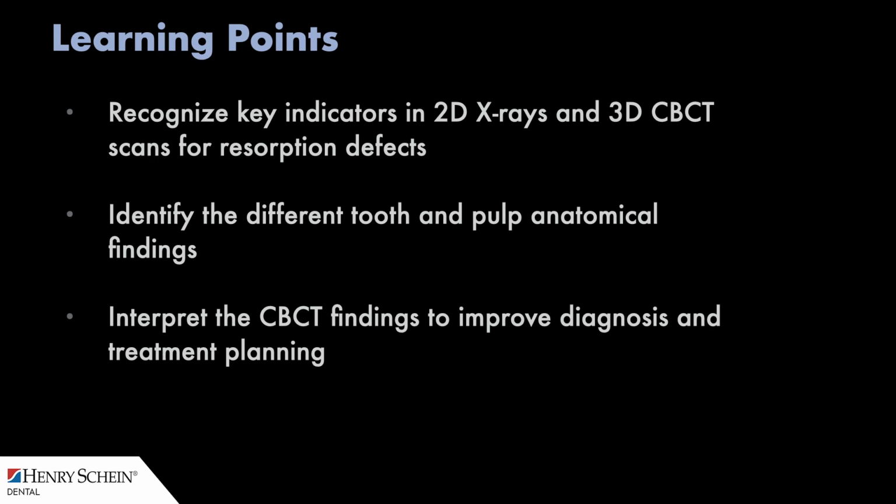Today, we're going to be discussing some of the key indicators in 2D X-rays and 3D CBCT scans for resorption defects. We're going to be discussing what these defects are, how involved they may be, and whether or not they can be treated. And we're going to evaluate what those findings are that allow us to know whether or not those resorption defects can be treated, and that's using CBCT.